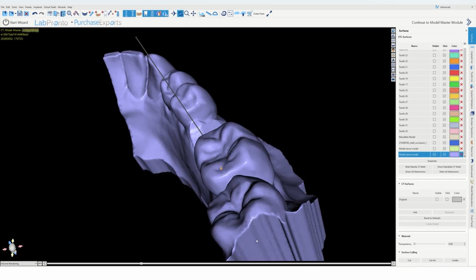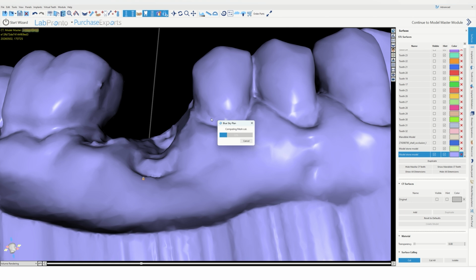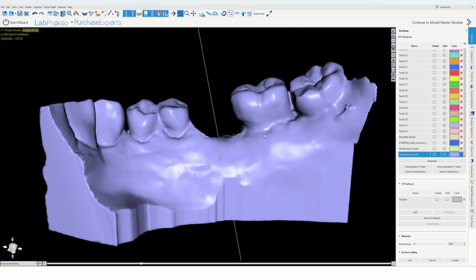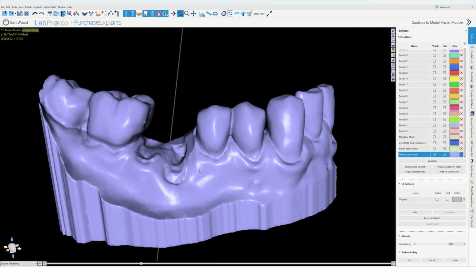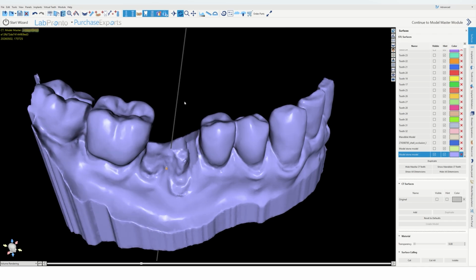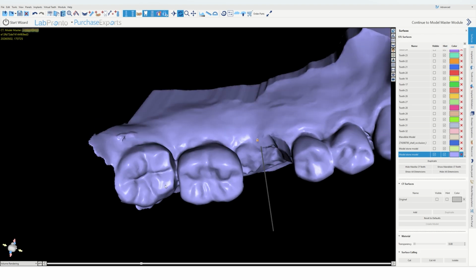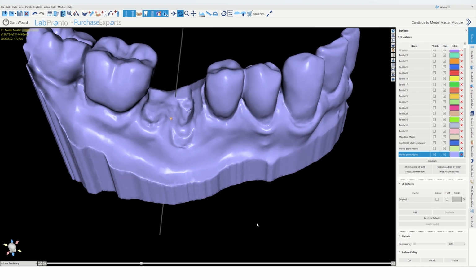All right, get out of cut mode. Let's examine. Okay, I'm happy with that. Okay. So now that we trimmed out those chunks of tooth that will be extracted. Now, by the way, let's get rid of this junk over here. That's ugly. Yeah, that's better.